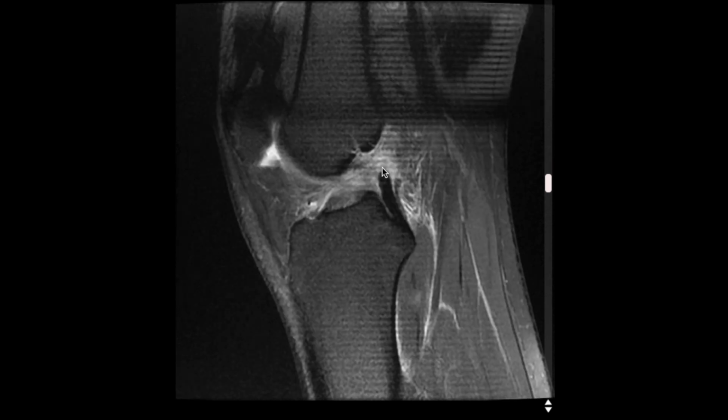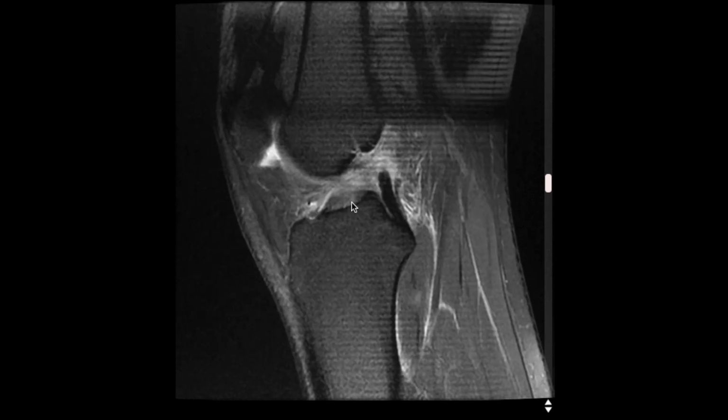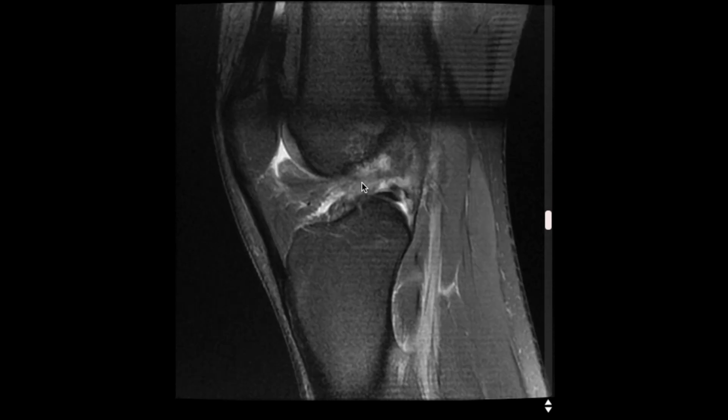As we continue to scroll, what you'll see is a significant amount of fluid and edema within the ACL fibers that are left, but you did not see that same black line coming up through the middle of the knee, which would be consistent with an ACL tear. Take a look here where you can see the PCL coming up the back, and as you scroll through to look for the ACL, you see no black line, so that would be consistent with a complete ACL tear.